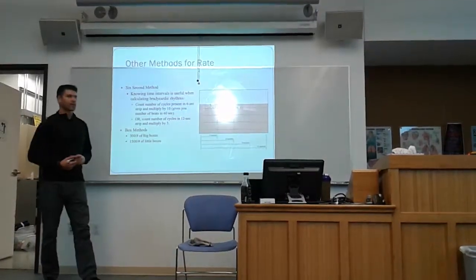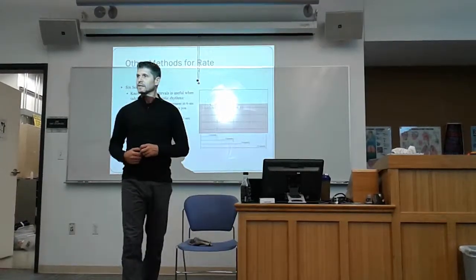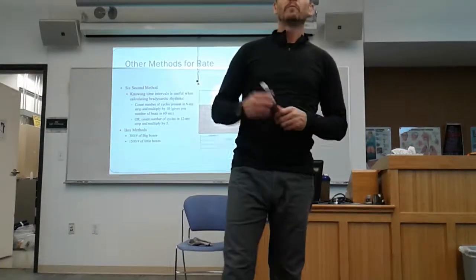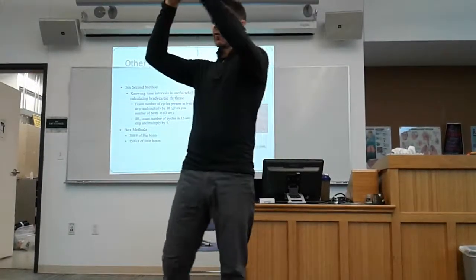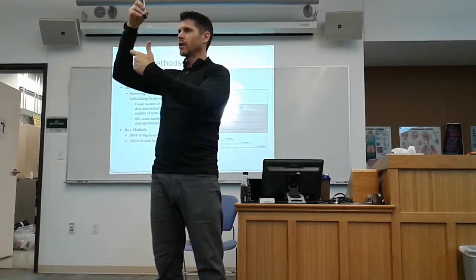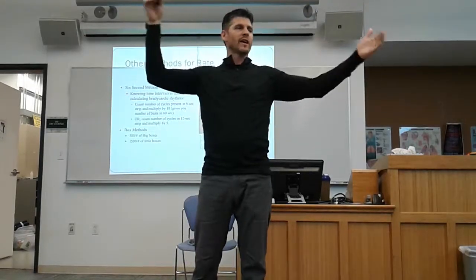You have to be a little bit careful. A lot of people will say just count the QRSs in that 6 seconds. I don't think that's adequate because that gets you off sometimes by a lot. So start on the hash mark, and wherever it falls on that cardiac cycle, maybe it falls just before the P wave, then count just before every P wave. However many you have just before every P wave in that strip.